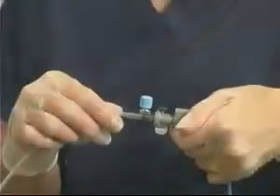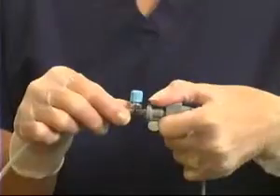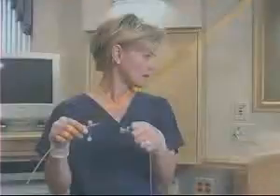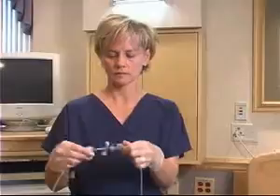If high baseline readings due to possible overcharging are observed, disconnect the catheter from the cable. The intrauterine pressure surrounding the sensing membrane will exhaust the excess air. Wait a few seconds and reconnect the catheter to the cable. The membrane will then be charged with the proper amount of air.